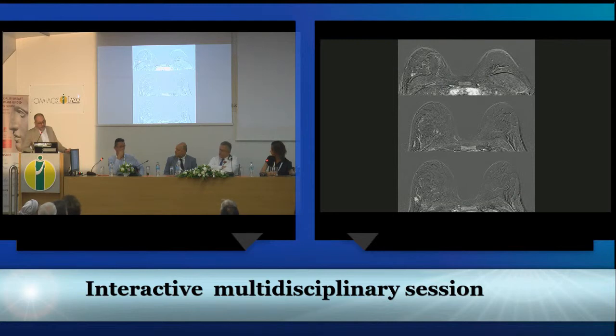Yeah, okay. Sometimes there are a lot of lesions, so it's not possible to do them all, but we prefer to do the different ones. Yes, so we did two different ones. She has more than 3 new lesions, other than the surgical side. They were far from the surgical side, so we did a biopsy of 2 of them, and they were also malignant.